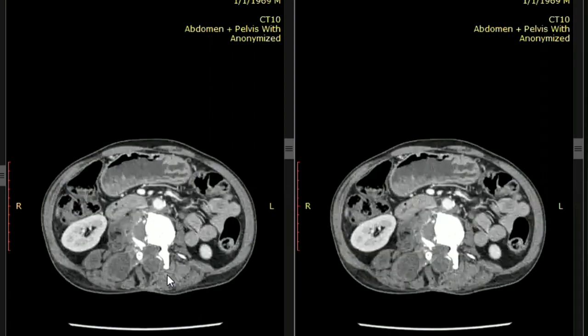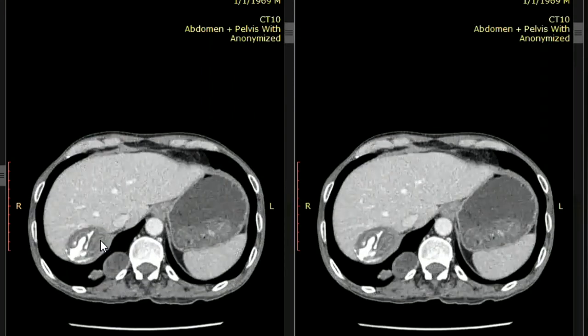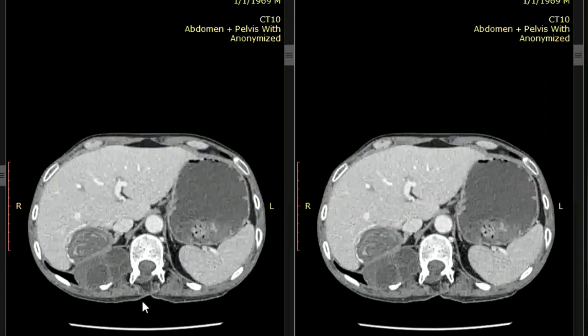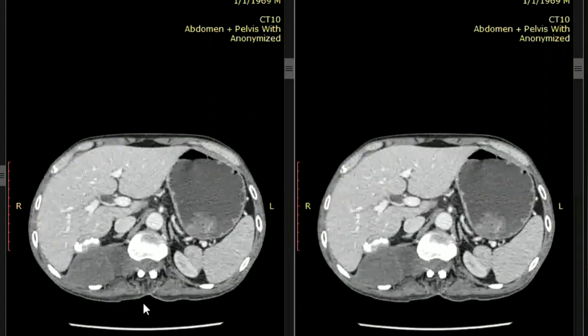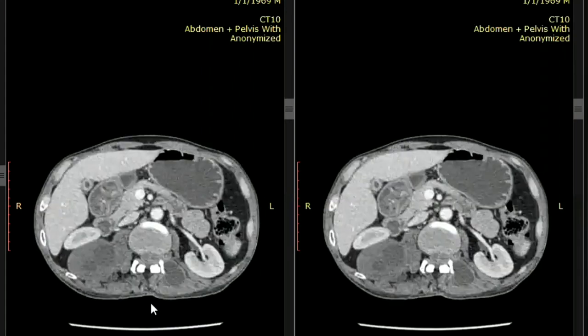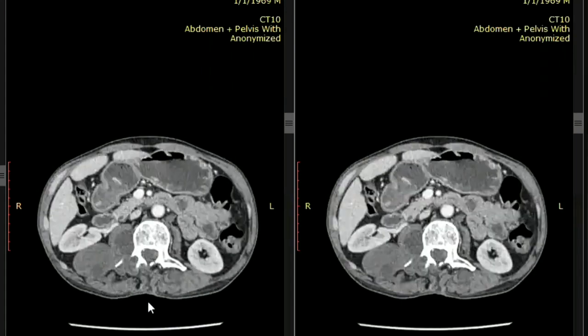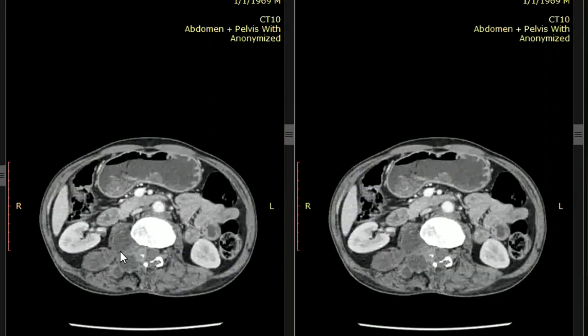So the catch to diagnose hydatids is the infolded membranes within, and then you can always ask for a non-contrast CT to confirm. This was calcification, by the way. So daughter cysts and multiple infolded membranes within a cystic lesion with calcifications. If you review some literature articles, there are typical similar cases with erosion into the bones. And this is also extending into the spinal canal at some levels.